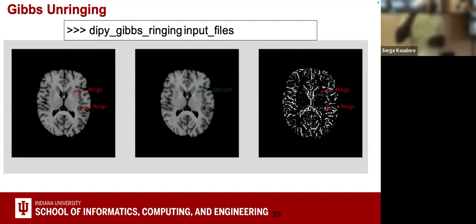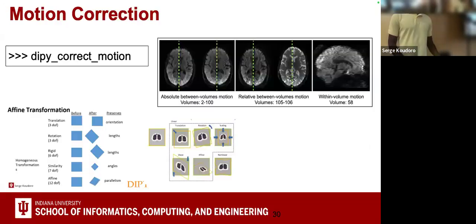And here, this is the same principle. So now we try to tune to say, hey, how can we remove this frequency that we don't want? So using FFT is very efficient for that.